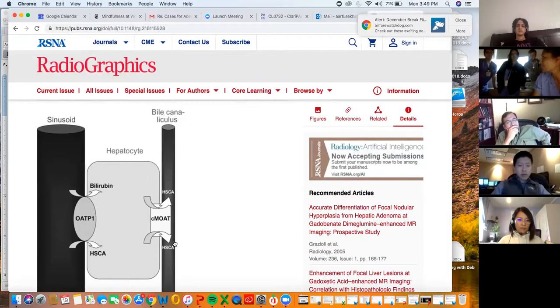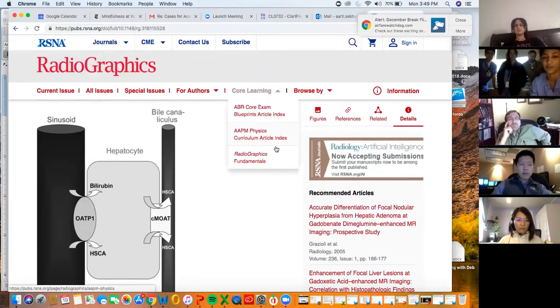tree. So if it's too high, in this case, they wanted to know more about the biliary anatomy, which we were able to show with the MRCP. But the fact that the EOVIS wasn't excreted, we kind of knew that was going to happen because the bilirubin was so elevated.